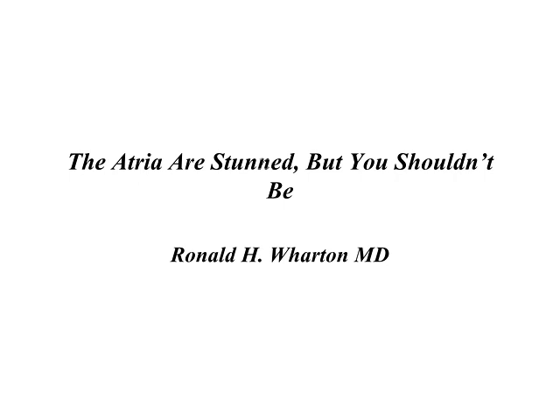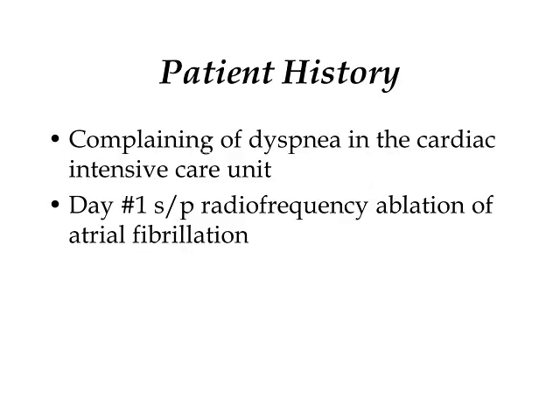I thought I would share a case with you which I call "The Atria Are Stunned, But You Shouldn't Be." There is a patient in our CCU, or at least there was one day, who had an atrial fibrillation catheter ablation the previous day, and the next morning he's short of breath and has an echocardiogram. Does the echocardiogram give us enough information to explain why he is experiencing dyspnea, or do we need to do any further tests? That's what this case is all about.